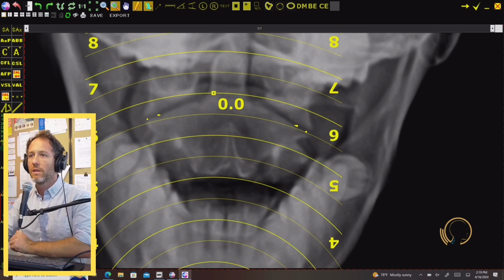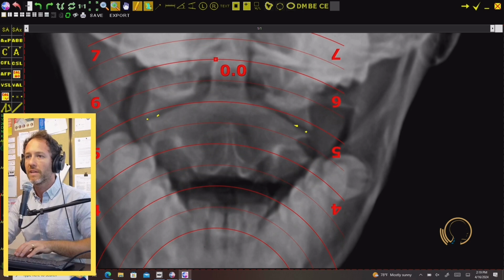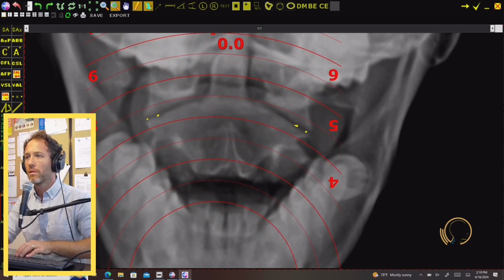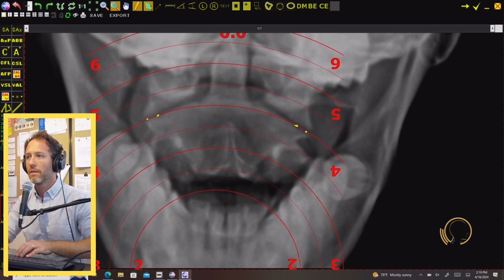All right, so I guess I'll show you that. All right, so you would drop your tool through those lines. You want to find the corresponding axial circle to those dots, right? So we'll say 4 probably is. Yeah.